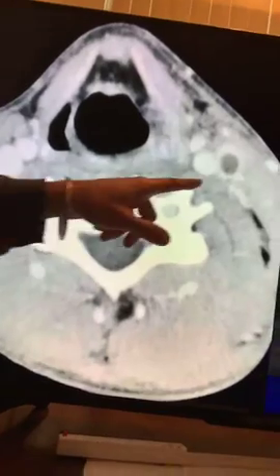It was a CT scan, not an X-ray, right? So here's the CT scan. This is what I had pointed out right here. Say you're gonna place a central line, all right? I want you to look at that IJ. Say the patient's IJ is collapsing. They're not that fluid overloaded, they're actually depleted. The IJ may not be nice and plump. What can you do? Put them in Trendelenburg, get their head going down, right? And then once their head goes down, it's going to engorge that vein, and then you can go and access it from there.